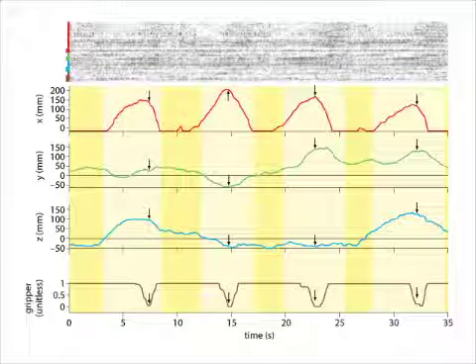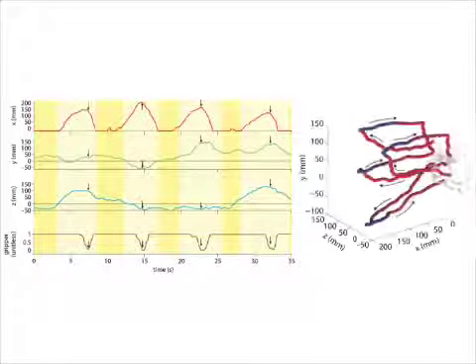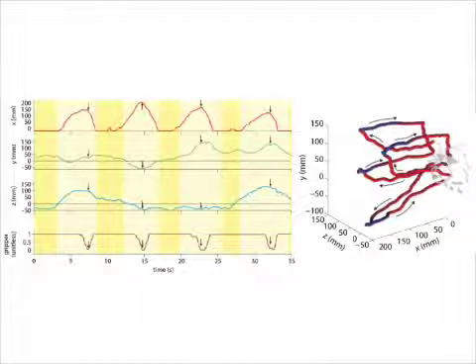Given the monkey's success in grabbing the marshmallow, it is clear that movement direction can be successfully predicted by the population activity of motor cortical neurons. The same axial datasets can be converted to a 3D representation to provide a more intuitive view of the motion and action of the robotic arm.